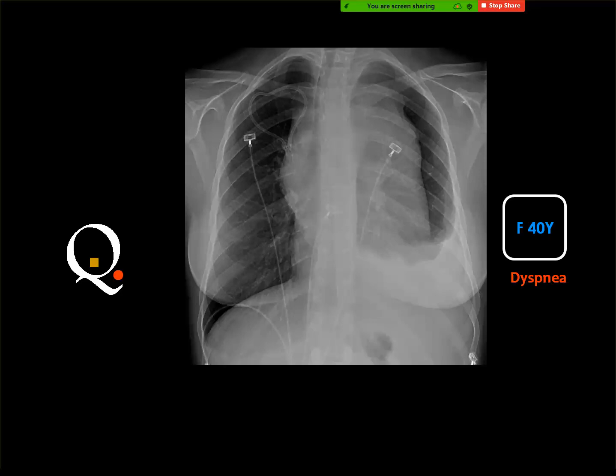Left side effusion. Pneumothorax. No. Mesothelioma. Effusion. No. Left side. There is pleural effusion, okay, but you see this very big mass in the mediastinum. Pulmonary edema. The lung is clear, but this mass is a mediastinal mass.